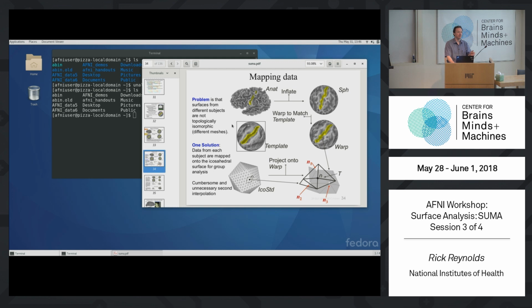Just as a reminder, doing this map icosahedron method, FreeSurfer or whatever package that you use to create the surfaces generally makes a warped sphere data set so that the single subject's contours get warped to align with their template somehow.